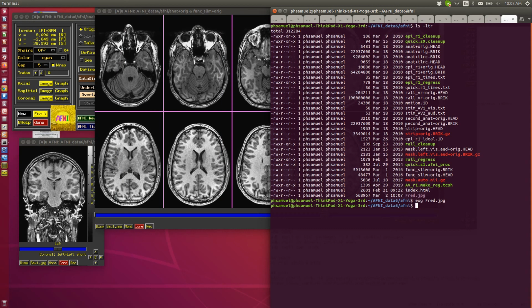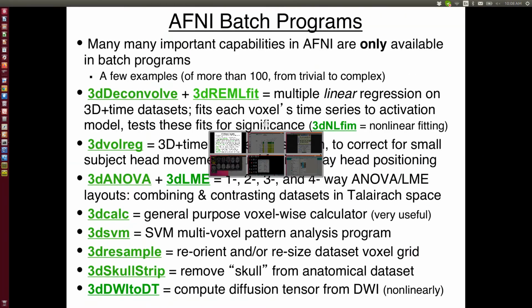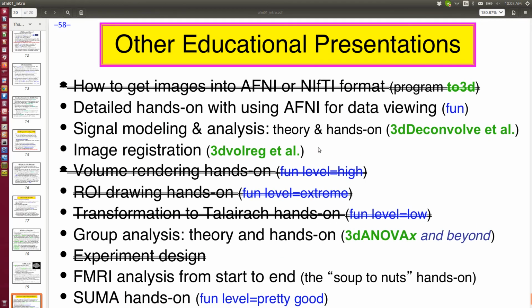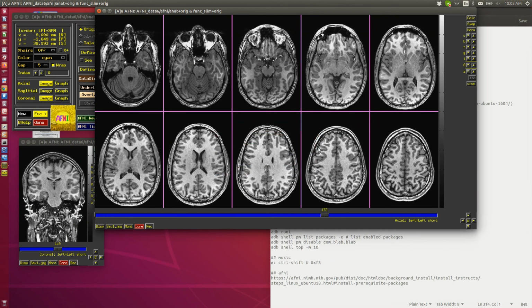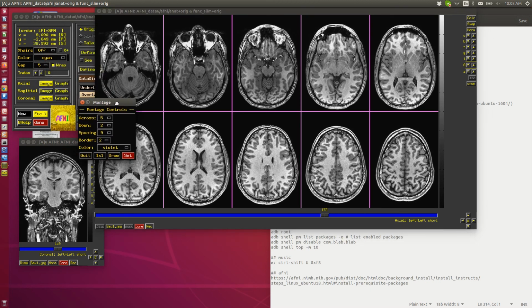So, close this to put AFNI back to the front. That's the AFNI image viewer. I have 5 more minutes, and now I'm going to turn the montage off. To do that, I open the montage button again and click 1x1 at the bottom. You could also do that by setting across and down to 1 each, but this is just in one step, that's all. I turn the crosshairs back on because I want them back on.